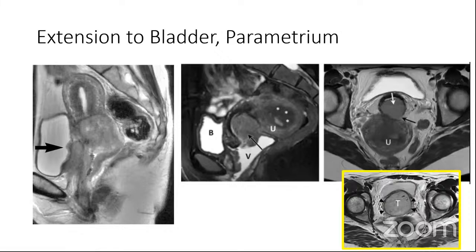And of course, we can also see there is some indentation into the bladder cavity. So that again suggests bladder invasion. So this can be confirmed. So mucosal invasion is going to upstage the disease to 4A and not a mere wall invasion. So I hope you all are clear about that.